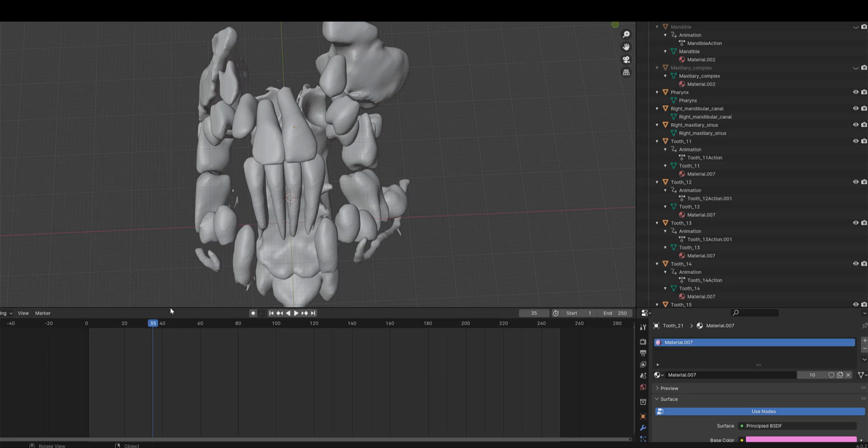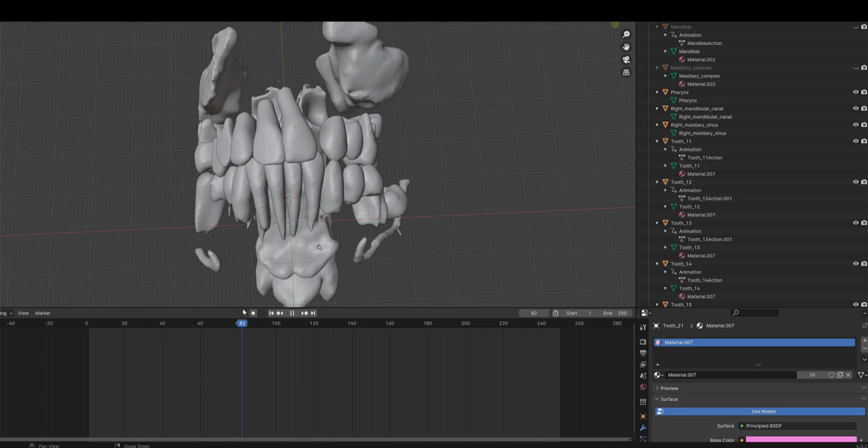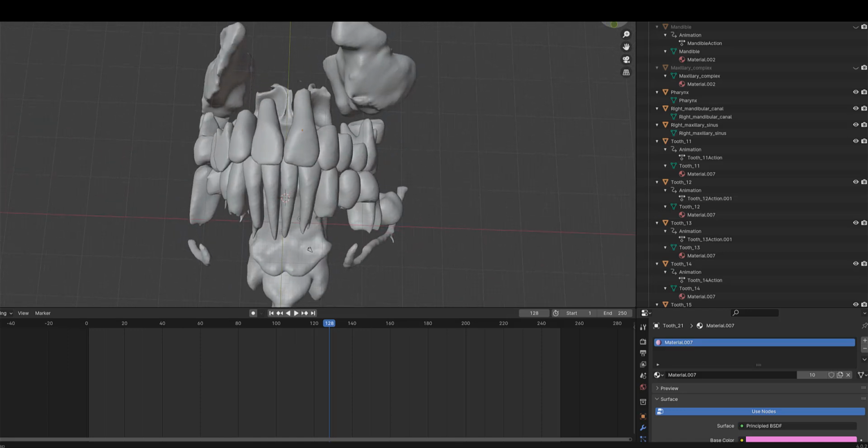And then what we do, we start moving the teeth using the timeline and correcting the malocclusion. This was done fairly quickly. And what we also did, we extracted the upper left lateral incisor because there was not enough space. So now we have a canine substitution. And at the end of treatment, we have corrected the torque of the upper left central incisor.